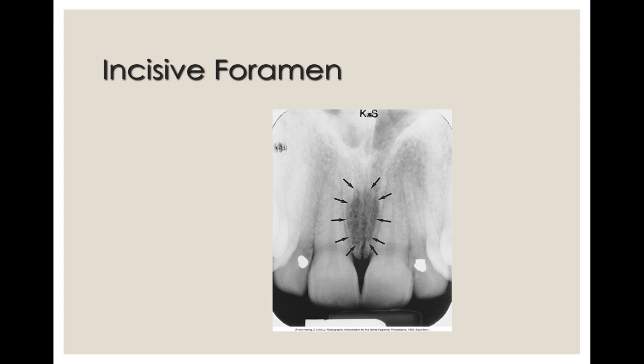So as we go over these, I'm going to be giving you both a description of the anatomical finding as well as what it appears like radiographically. This will be important for your exams as well as being able to interpret radiographs in the real world, because questions on your exams especially will be going over both the anatomy as a description, or it can also do it as a picture. So knowing both of these is going to be really important.